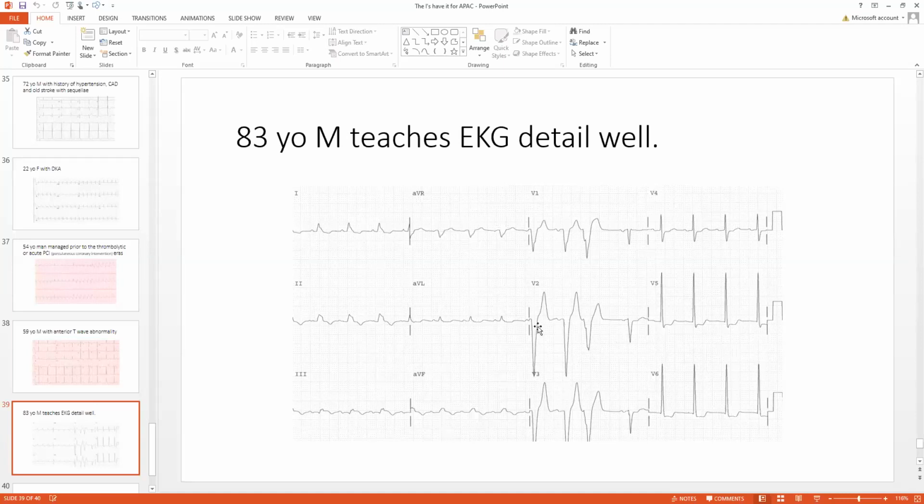But if there were ST elevation in the anterior leads, well, then it would have to be 5 millimeters in order to call an acute anterior or anteroseptal myocardial infarction. And these are the Sgarbossa criteria. Well, there's increased ventricular ectopy because of this inferior infarction. And after the premature ventricular beat, out comes narrow QRS conduction. And what we find is that the patient has large voltage and repolarization changes of left ventricular hypertrophy.